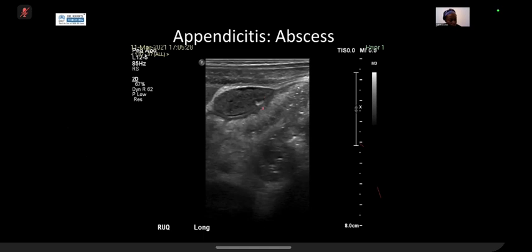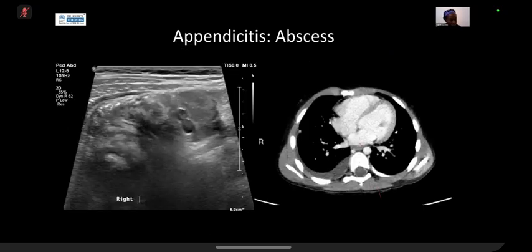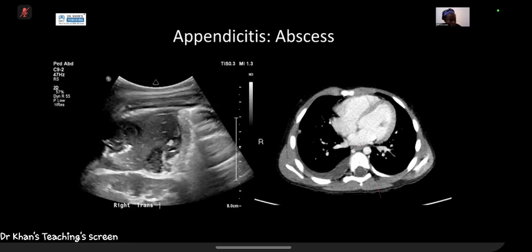And then this is all inflamed mesentery around and dilated bowel loops with an ileus. And they went on to have a CT because initially we weren't sure if it was due to the appendix. We weren't sure what was going on, and to get some more information for the surgeons. And I can't show you the CT because my videos aren't working, but the CT demonstrated a perforated appendix with a collection due to a retrocecal appendix. But you could actually see the collection better on the ultrasound than you could on the CT, which we'll show you when Sam lets me use her slides.